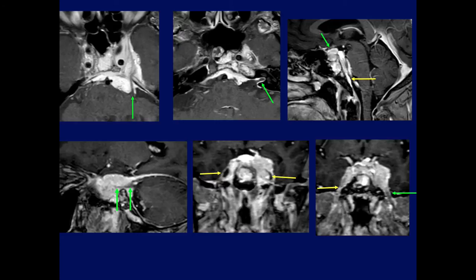And here's a case that Pradeep alerted me to last Thursday. The patient had no symptoms, and it was incidentally found on a CT on an outside examination. Note the marked involvement of the cavernous sinus extending posteriorly, encasing the trigeminal nerve, invading the internal auditory canal, and along the clivus here, and also invading the other side, as well as the foramen ovale and V3. So this is not unusual.